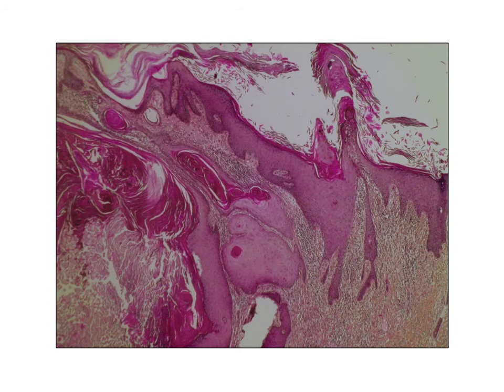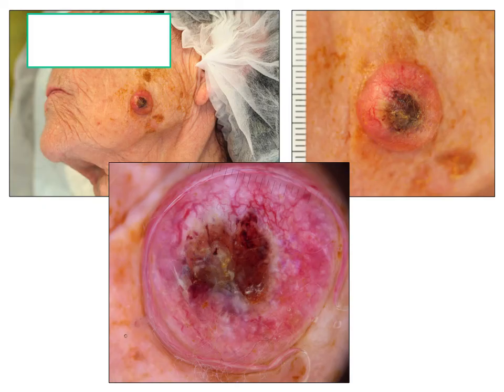In crateriform squamous cell carcinoma, on the edge, we will have a long border aspect, and in this long border aspect, the subpapillary horizontal plexuses will be prisoners and pushed up by the tumor. And this is why in the periphery of these lesions, we often observe these arborizing vessels.